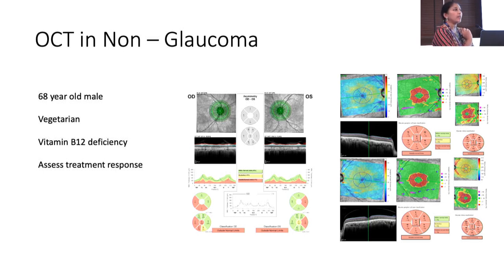As he was a vegetarian, his vitamin B12 assay was also done, which was also found to be less than normal. And another importance of this case is that this OCT of the optic nerve head and RNFL can be used to assess the treatment response to vitamin B12.